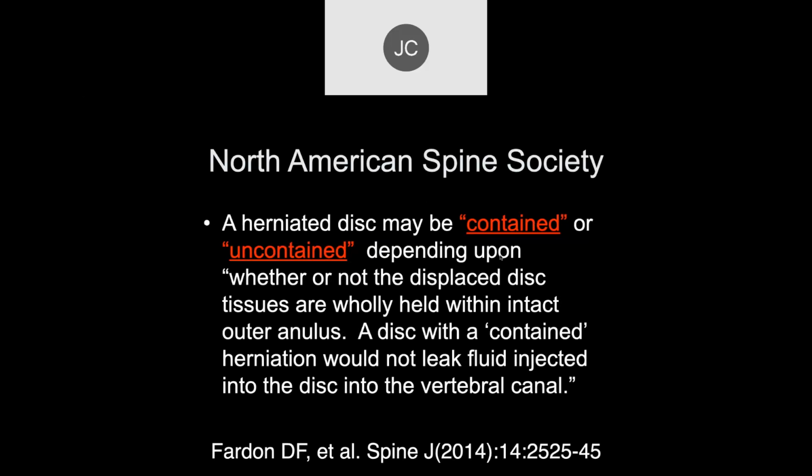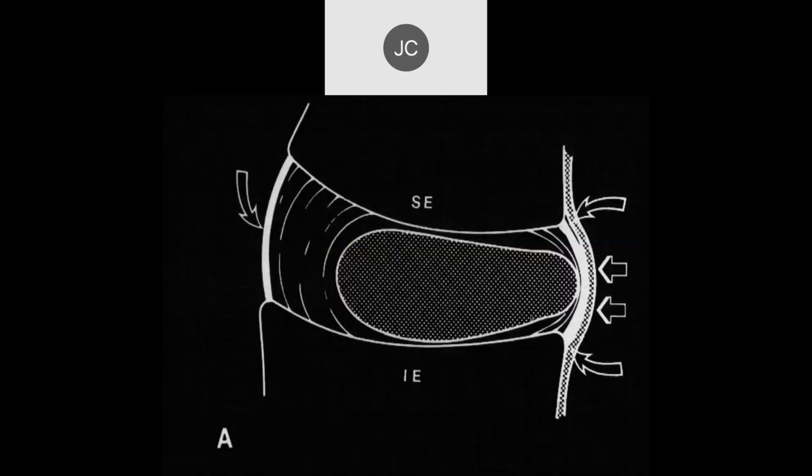And that has to do with whether all the disc material is contained within the outer annulus. And therefore, if you do an injection into the disc, all of your injected material will stay inside the disc and not extend outside the disc. And this is a little bit important.